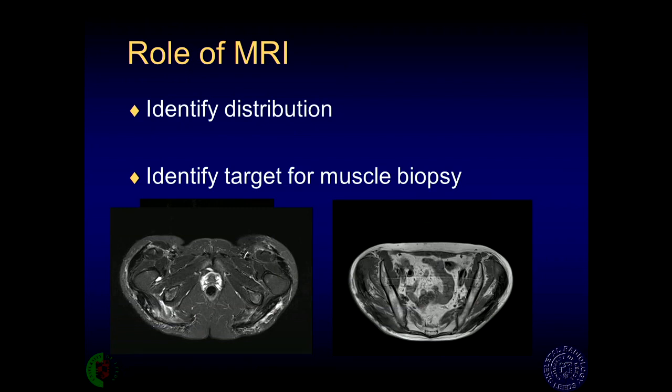And this is a patient with dermatomyositis, just showing you muscle edema here in the gluteal muscles with this quite extensive fascial calcification extending round, and a little bit of fascial edema also present, most marked here on the left side. And that's a typical case of dermatomyositis.